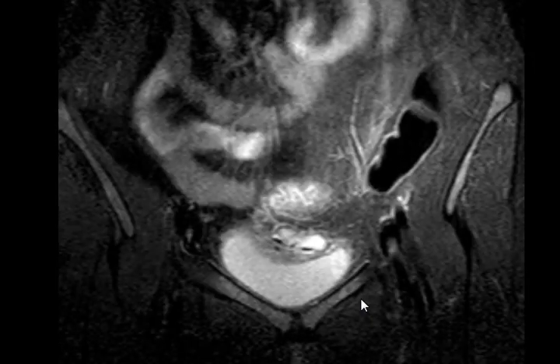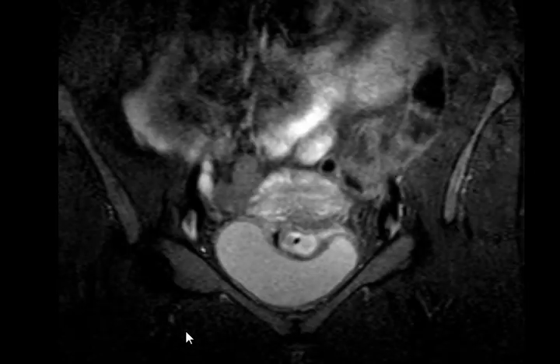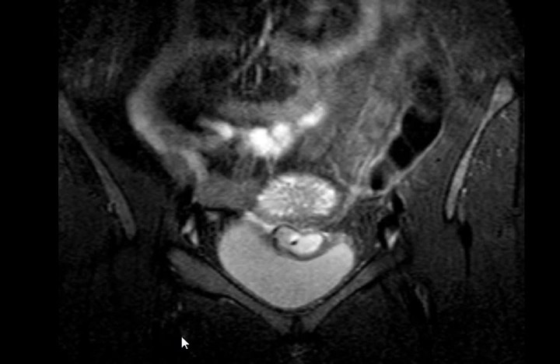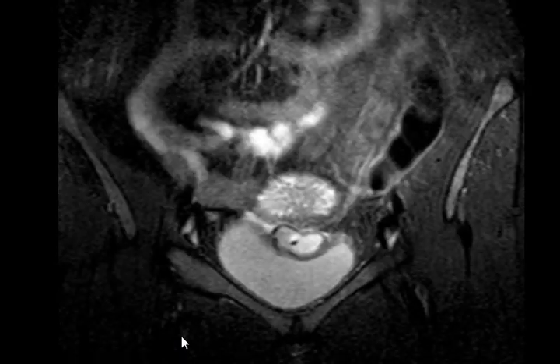What does this look like? What does it look like? You've seen it a billion trillion times, just not here. Huh? Yes, it's an IUCD.